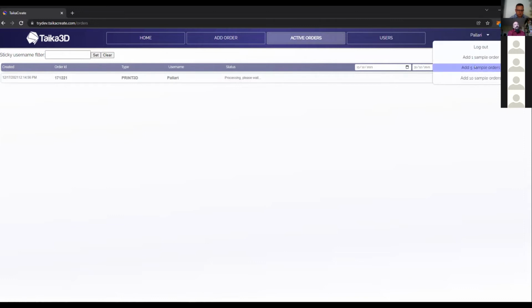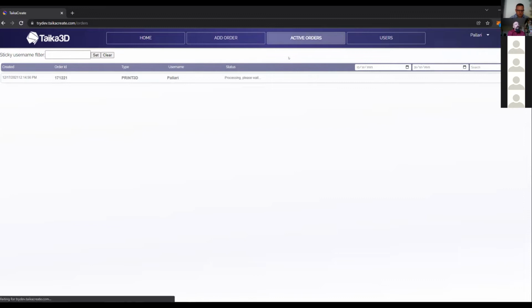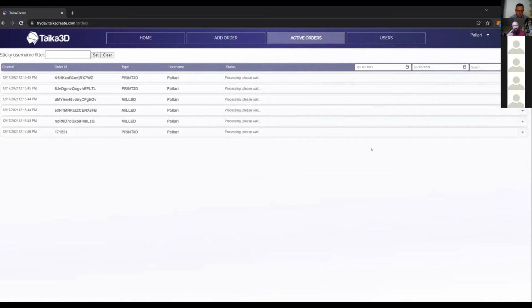And for the sake of the demonstration, we've got this little cheat, a batch of orders that we can just throw in the app here, so that I don't need to manually fill in all of these. So you can see that we've now got a total of 6 orders here.